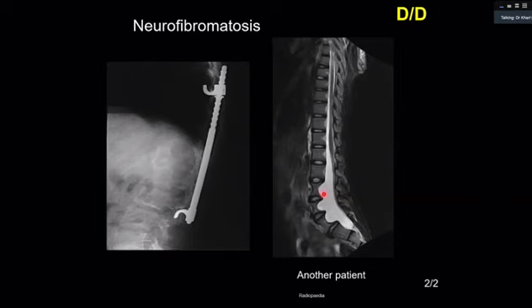And you have to discriminate. Please remember that in neurofibromatosis, there can be just dural ectasia causing the posterior scalloping. And in other cases, there might be some tumor also, as in a schwannoma or a neurofibroma sitting there. So both of these can cause posterior scalloping.